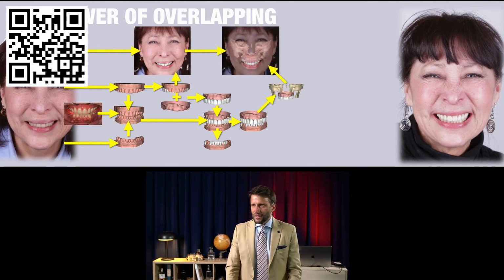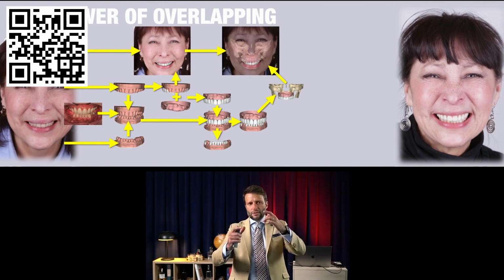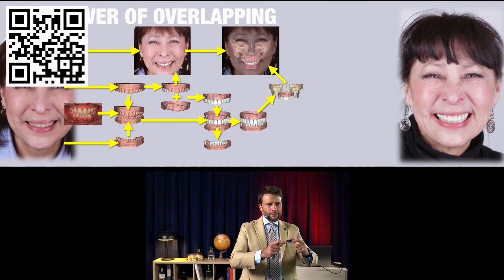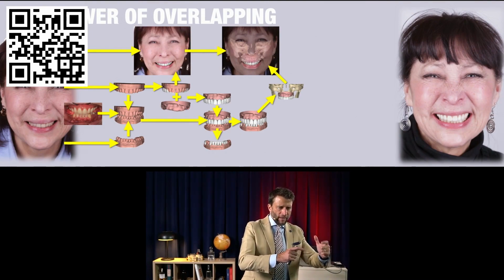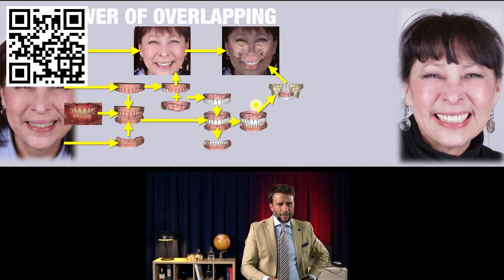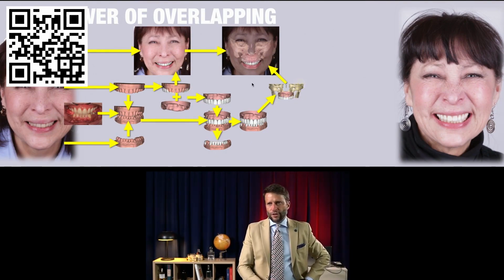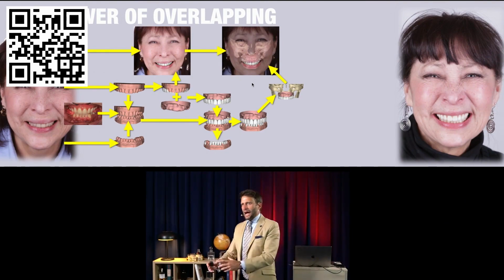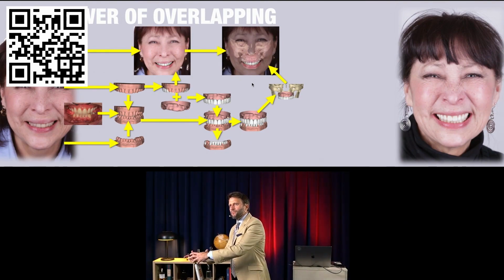The bone. Since the bone is overlapped to the denture, that is overlapped to the ridge, that is overlapped to the design, that is in harmony with the face, what do you have now? Ideal design with the bone. Facially driven design and the bone.